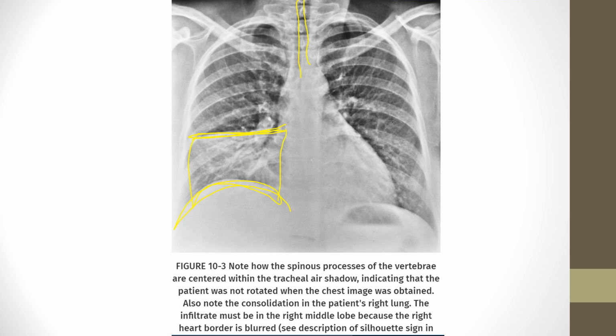What about penetration? Can you see vertebral bodies through the cardiac shadow? And you can, right? I'm highlighting the areas in between the vertebral bodies. So it's not overexposed. It's not underexposed. It's not rotated. So there you go. We're looking at a decent quality image, right?